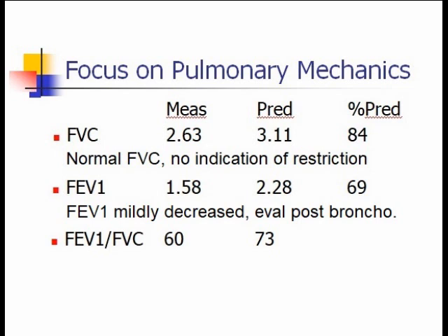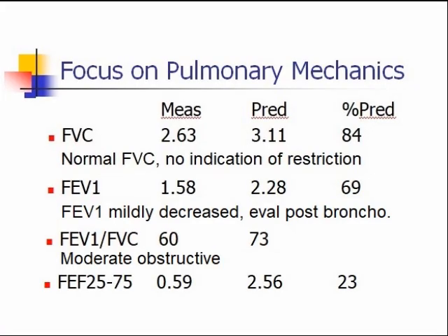Take a look now at the FEV1 to FVC ratio. So the FEV1 to FVC ratio is 60%. That causes it to fall right in the moderate obstructive condition. Not much more we can say about that.